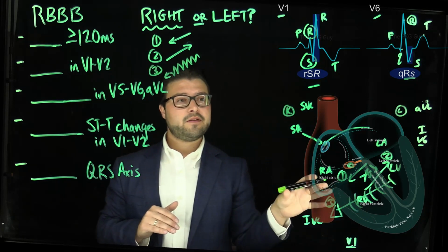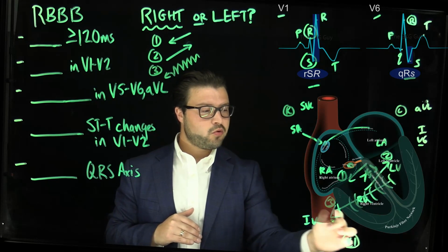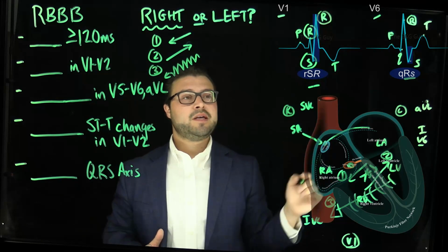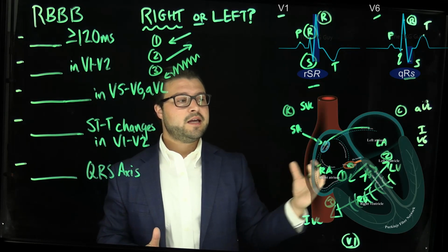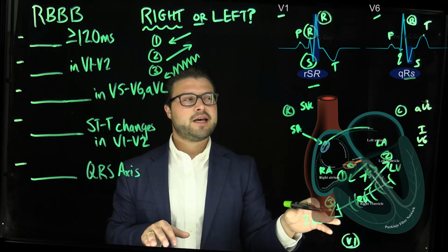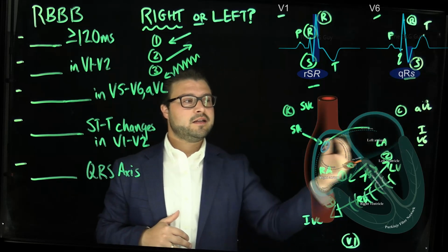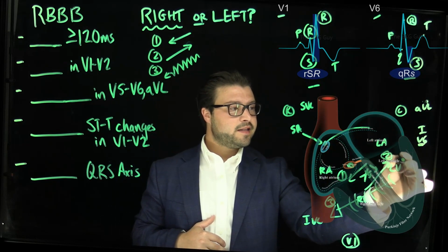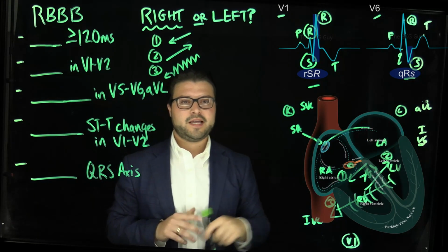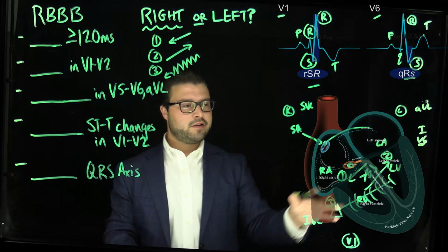And so what does that final vector account for? Well, again, look where it's coming. From left to right, it's coming towards that right precordial lead, V1, and as a result, we get this big R wave upstroke, okay? And that's that slow cell-to-cell depolarization, that main vector that you're seeing account for that. And it also accounts for this S wave that you see in the lateral precordial lead. So here's V6, that vector is moving away from it, and so that's where that S wave comes about. That negative, that terminal negative deflection in V6, that S wave is a result of that.